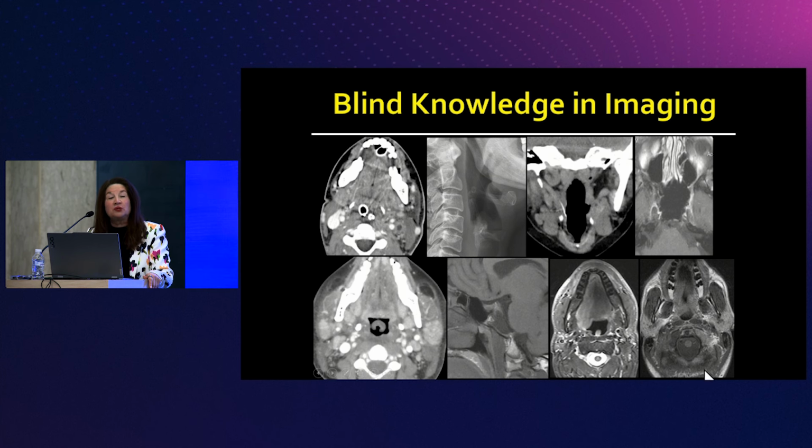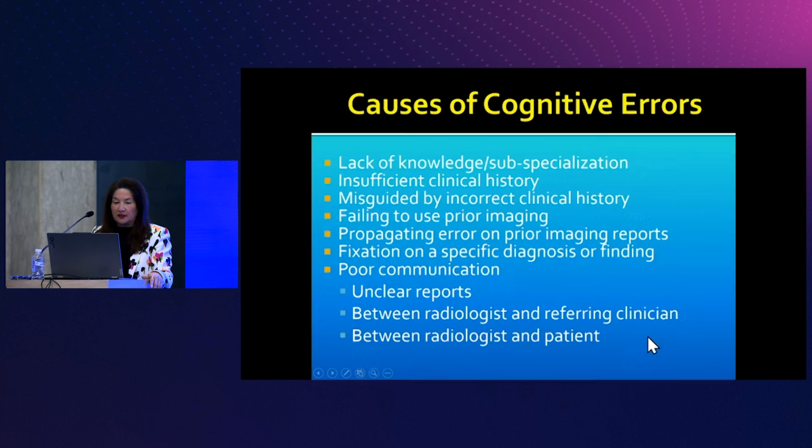And the perceptual error that occurred with this cognitive error was the metastasis to the occipital condyle. You see the normal fat on the opposite side. And this has gone into the hypoglossal canal and paralyzed the tongue. So that is the perceptual error with the cognitive error.